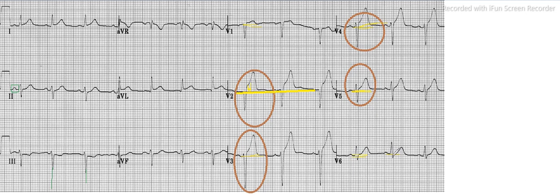So as we have already discussed in previous videos, if there is any ST segment morphology abnormality in lead V1 or V2, that will suggest septal MI, and if there is only lateral V5 and V6, then it will suggest lateral MI. But you see here in this case, it is involving V2, V3, V4 and V5. So this is suggesting anterior MI.